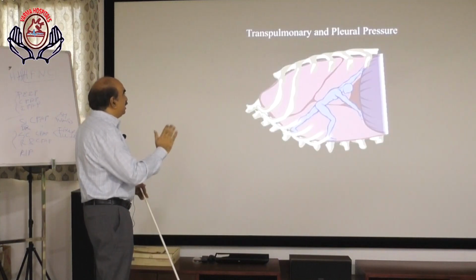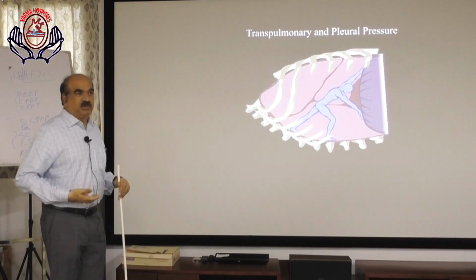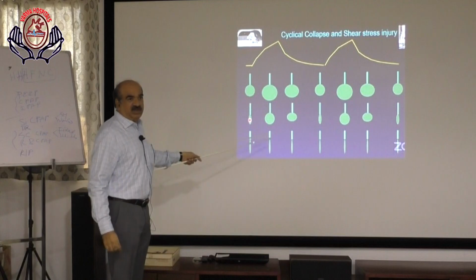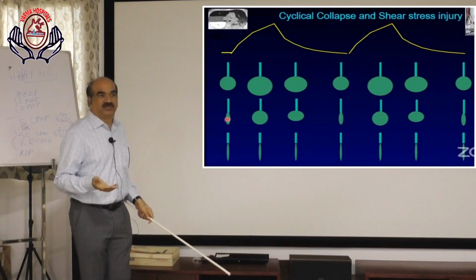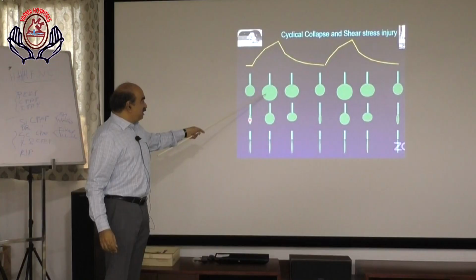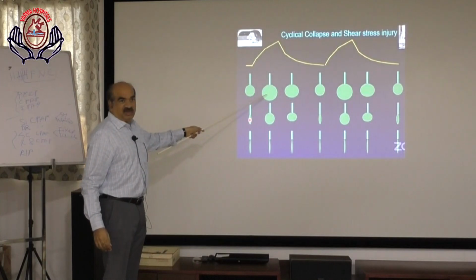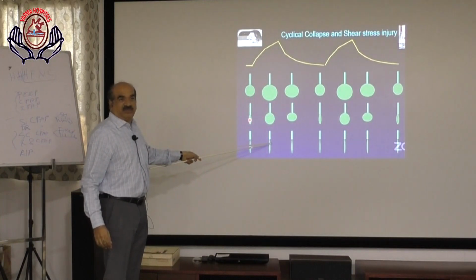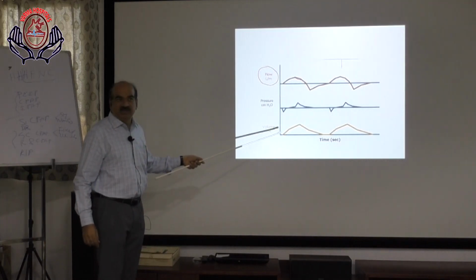Most importantly, we should assess the transpulmonary pressure, pleural pressure, and other factors like abdominal pressure. Even cardiovascular hemodynamics we should monitor. Even in ARDS, alveoli are heterogeneous. Whether alveoli are distensible or non-distensible, whether alveoli are recruitable or non-recruitable. These are distensible alveoli. With increased tidal volume, there is distension of alveoli. These are distensible alveoli. These are non-distensible, non-recruitable alveoli. So, what is this breath pattern? What does it indicate?